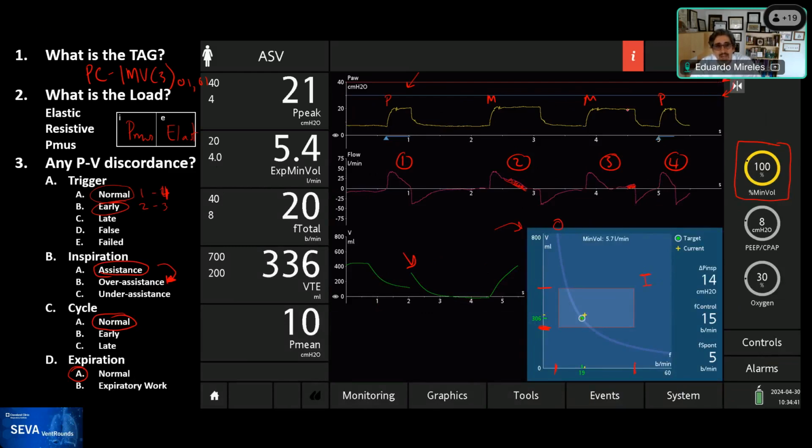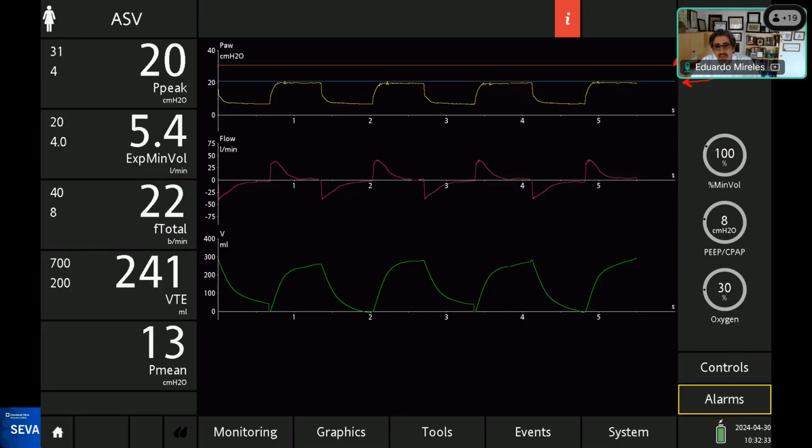What the ventilator has is, if you set a pressure limit, which in this case was 40, the inspiratory pressure will not go higher than 10 centimeters of water below the pressure limit that you have set. Why they said that, I don't know, but that's there. Here I had changed the pressure limit to 30, and you can see that now the pressure would not go above 10 centimeters below it, the inspiratory pressure set for the ventilator.